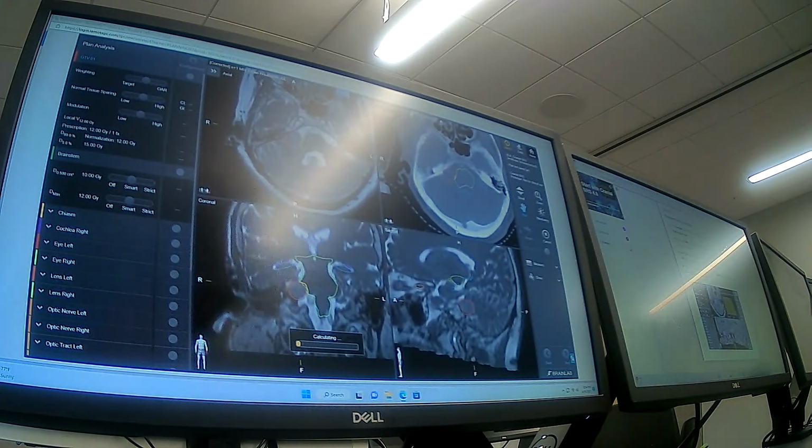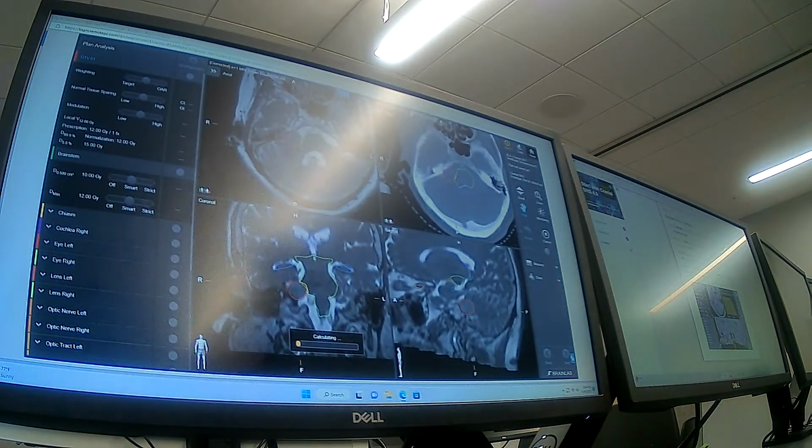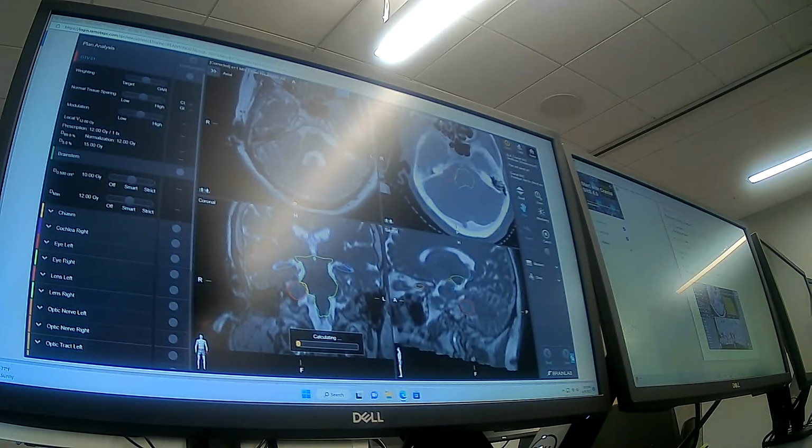Mr. Hellman has all greens. All green, baby. I'm ready to go. I'm ready to treat. It's good in there right now. Cinnamon line. Yep. Oh, also, step 5 is further down. Step 5. Yeah, for some reason step 5 is not a moment. Yeah, that's what I said.